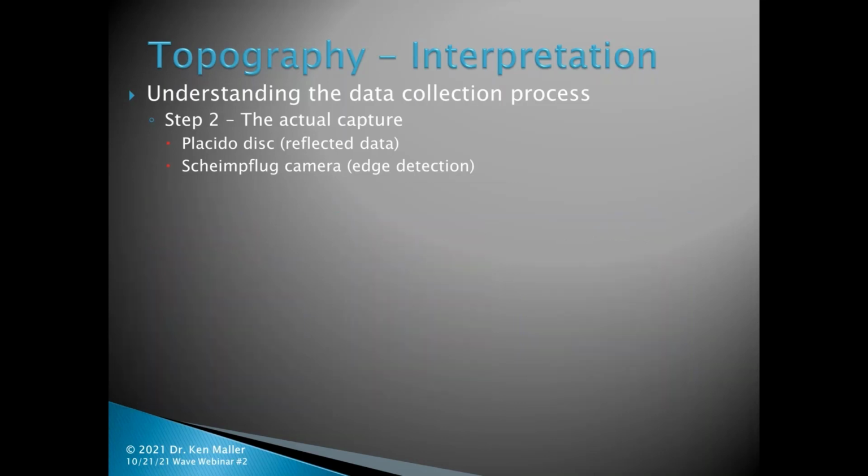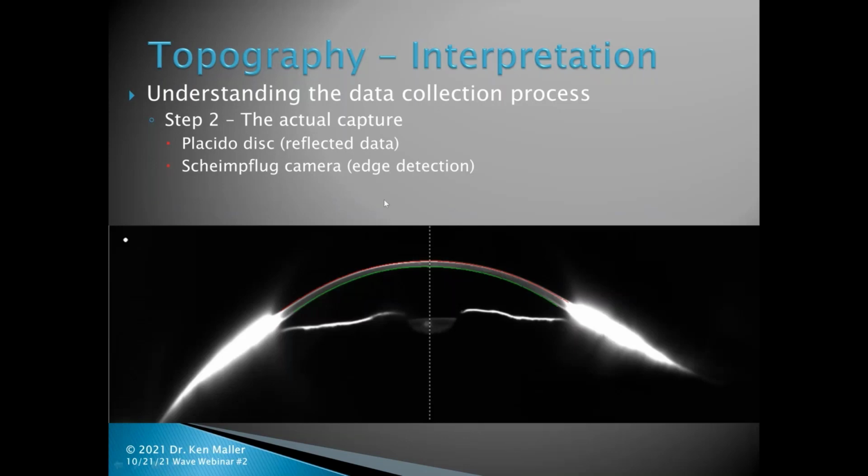All right, so let's move on. Here's the Sirius camera, and although this uses entirely different technology, by using edge detection technology from a camera, as opposed to the reflected data that the Placido disc uses, it is not immune to capture errors as well.